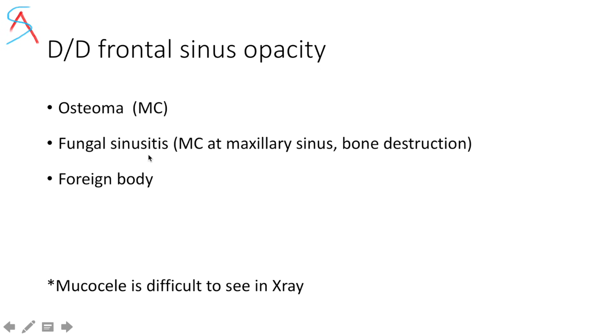Fungal sinusitis generally would be a fungal ball. This is most commonly seen in the maxillary sinus. It can occur in the frontal sinus also, associated with bone destruction. Third could be foreign body. Remember not to answer mucocele, because it is very difficult to diagnose mucocele on X-ray.